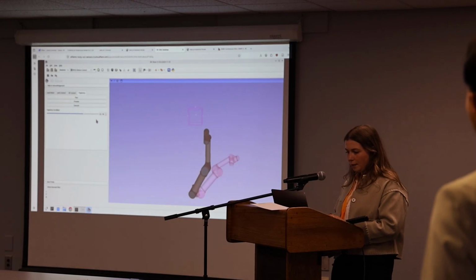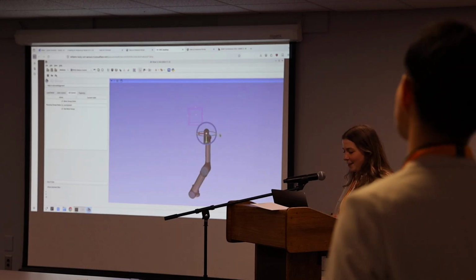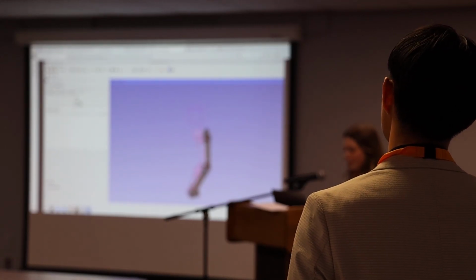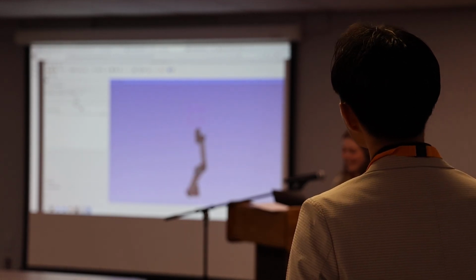Don't know why I've ended up there. Oh, I'm halfway through the trajectory scrubber, that's why. If you click a closer motion like this, that plan should be a lot less egregious, but let's test it. Yeah, it's just shifting over, and you can see that.